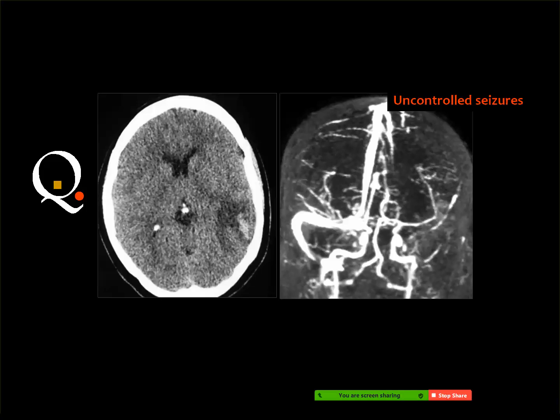Venous infarction, middle cerebral artery infarction. Venous infarction. Yes. And this is venous infarction because, number one, it is not in the classic territory of the middle cerebral. It is also hemorrhagic, and the MR venography shows that the transverse sinus on the left side, as well as the sigmoid and the internal jugular vein, are almost thrombosed with no signal inside. This signal corresponds to the internal carotid artery, and this is the middle cerebral and the anterior cerebral. There is some overlap of the venous on the arterial sides.